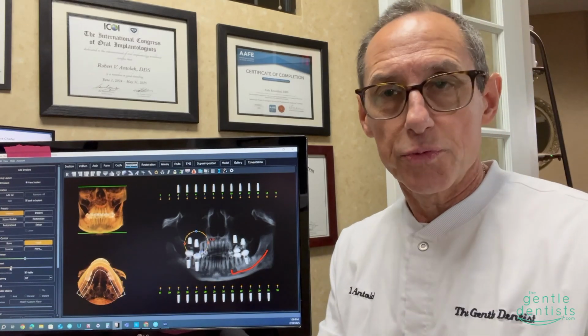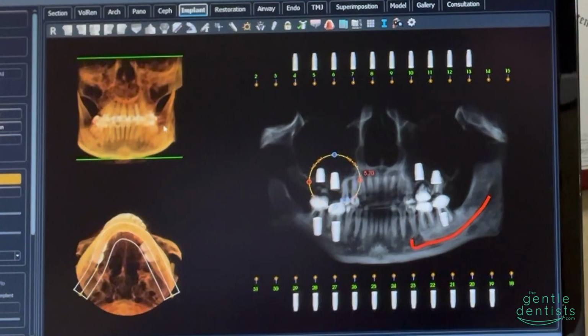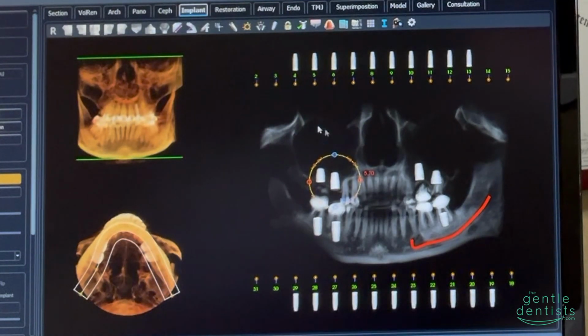So I have a patient here who I saw, and I'm planning on doing surgery on her soon. I just want to go over some of the details of this, okay? This is basically the skull, with different views here. I have planned to do 4 implants on the top: 2 on the upper right side, 2 on the upper left side, and then 2 over in this region over here, and 1 over here eventually. We can put virtual implants in, and move them around a little bit, okay?